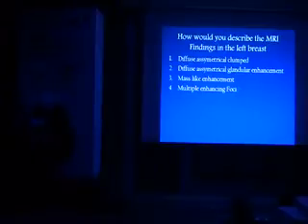Diffuse asymmetrical glandular enhancement. It's the same, but we have glandular. It's not really glandular. It's just involving the lower half of the breast. It's not the whole breast, and it is asymmetrical. So it's not glandular. Definitely it's not a mass. We don't have mass with borders or margin. Multiple enhancing foci, the term should only be restricted to those less than 5 millimeter and the background enhancement, like I said. So the answer would be number 1.